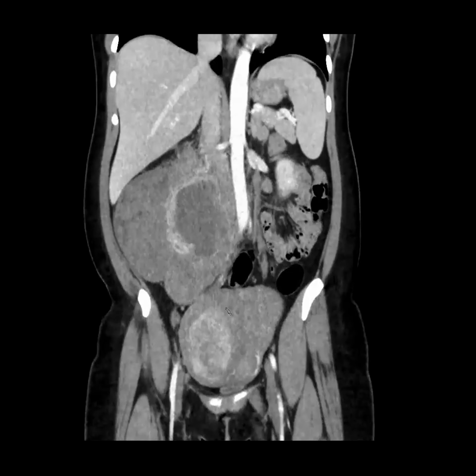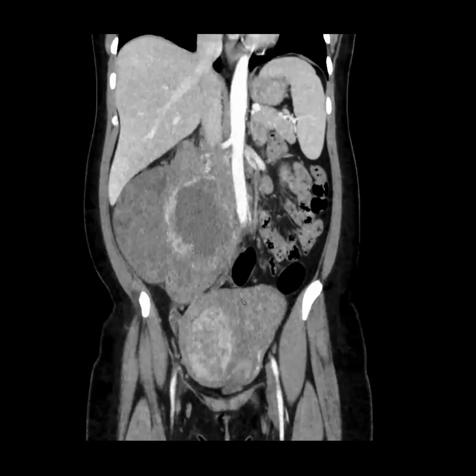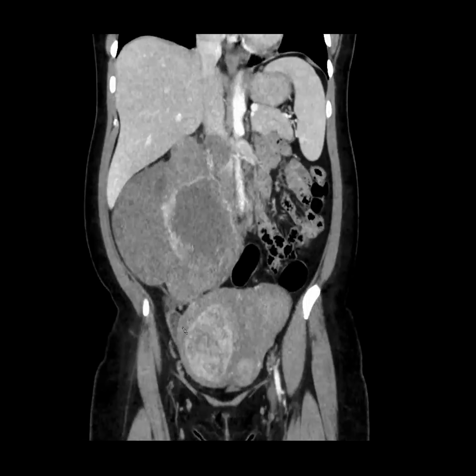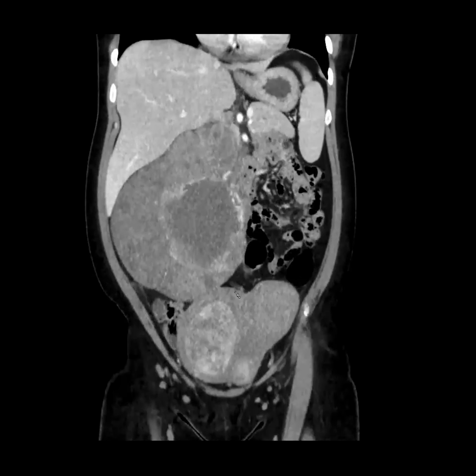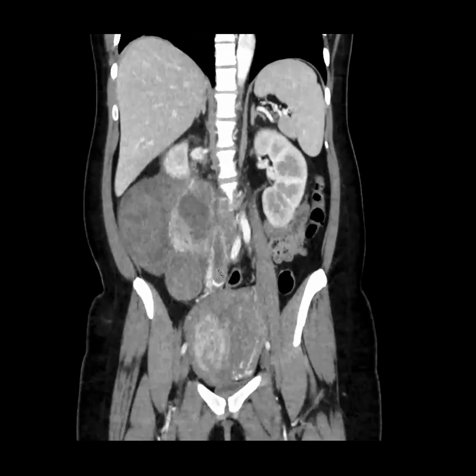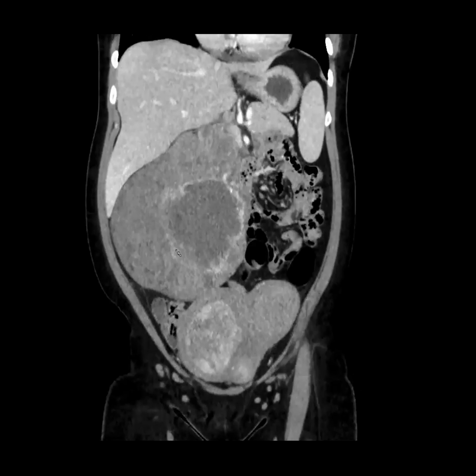Excellent, good. So even though fibroids are common and you always want to lump things together like Occam's razor, as we just heard about at the SAR film panel, you can also have Hickam's dictum, which is a patient can have as many diseases as they want. So these fibroids look more typical. They're very well circumscribed, but this thing is lobulated. It has different parts to it. It has this necrotic part. It's also in the IVC here, as well as in the gonadal vein. So anyway, it turned out to be a leiomyosarcoma.